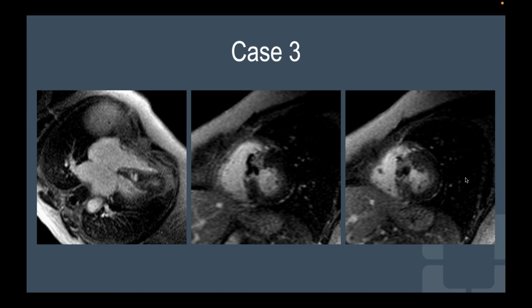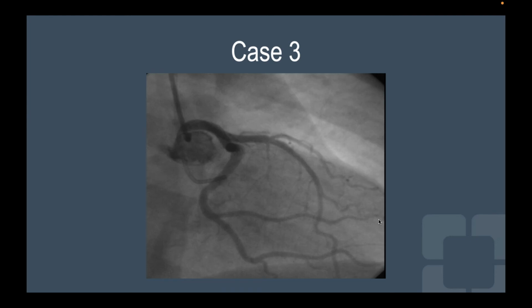So you picked up on all of the findings. There's a hypertrophic cardiomyopathy, somewhat asymmetric, and then there's that area of abnormal late enhancement in the anteroseptal segments toward the base, with clear microvascular obstruction centrally there. It has a very funny distribution. It's not what we see with infarcts, like you said. It's a very characteristic distribution.